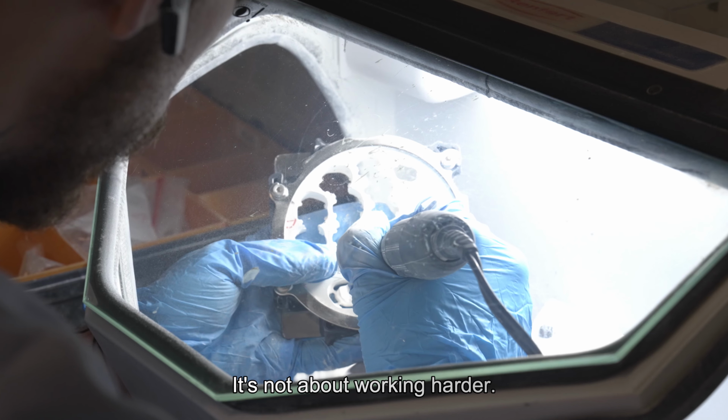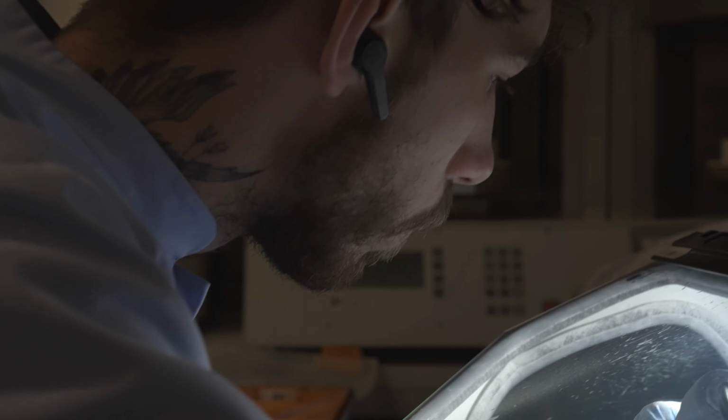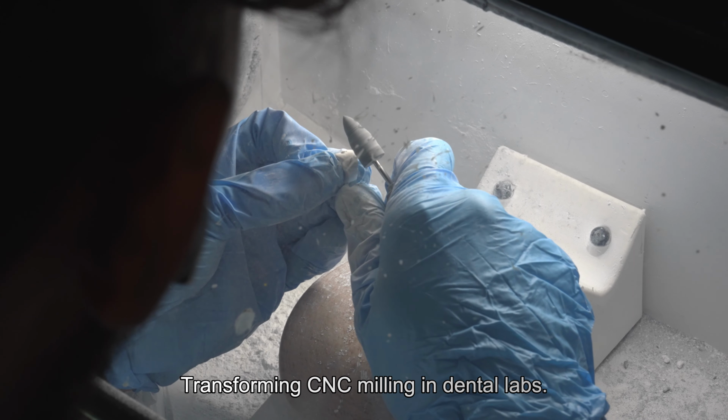It's not about working harder, it's about working smarter. Oqcam, transforming CNC milling in dental labs.